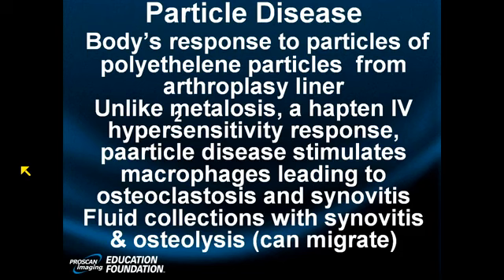So our patient has particle disease. They will eventually loosen. They don't have abductors. They have heterotopic bone. And this is not a joint you want to stick a needle in, because then it will get infected. Now let's go back to the case.